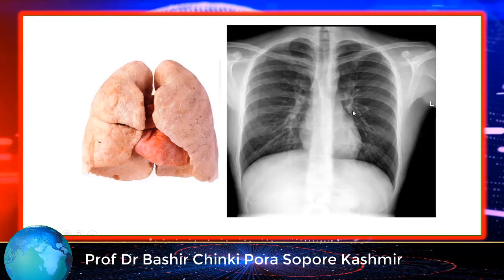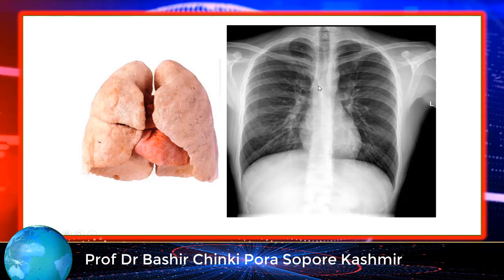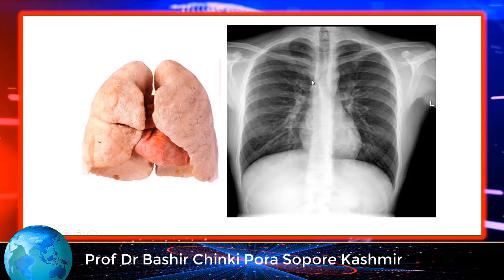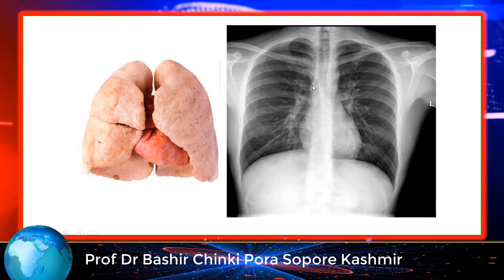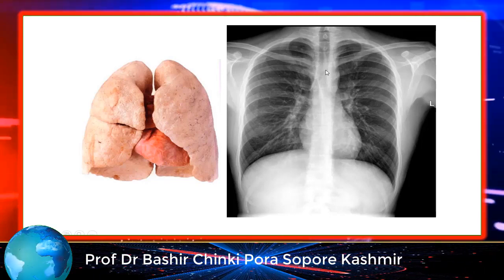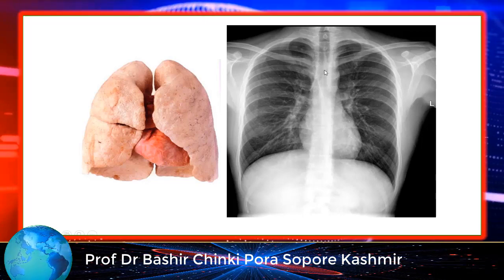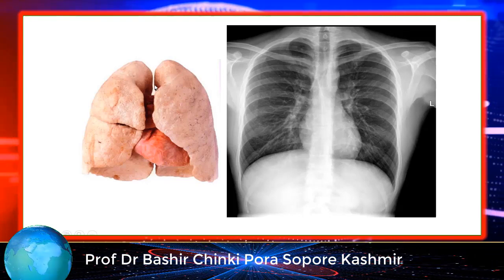Now in this radiograph, you find that this oblique line, we all know now, is the anterior junctional line, which ends at or near the azygos vein, that is here. And there is also a vertical line here which extends above the clavicle through the center of the tracheal air column, and this is called the posterior junctional line.